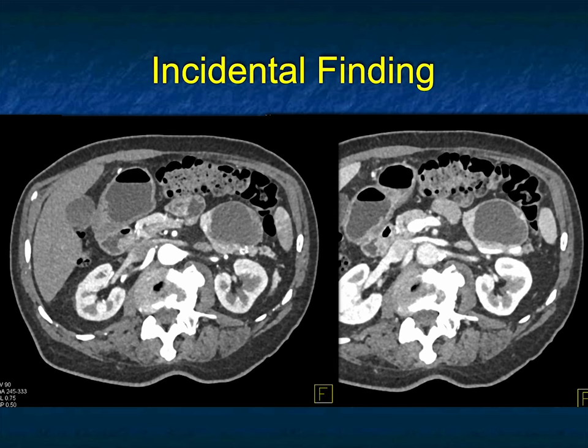What about this case? Cystic lesion, tail of pancreas, nodularity. Could it be an MCN? Yes. Could it be an IPMN with malignant transformation? The answer is yes. Serous cystadenoma is a possibility, but the wall is kind of thick for serous cystadenoma. What you really need to also think about, and we talk about this, is neuroendocrine tumors. Neuroendocrine tumors typically are hypervascular. They can be small, they can be large, but we do see cystic neuroendocrine tumors.